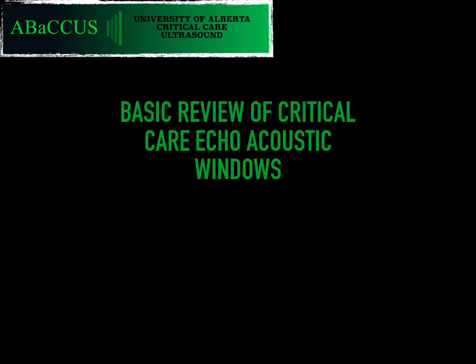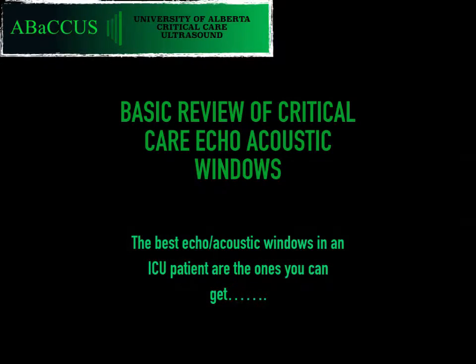So I just want to do a quick review here of the basic windows so we're all on the same page, recognizing that we're from a variety of backgrounds, and some of us with a lot of training and some of us with a little bit of training. So this is just a quick review of some basic windows so we can all understand the approach to how we look for, identify, and classify pericardial effusion.